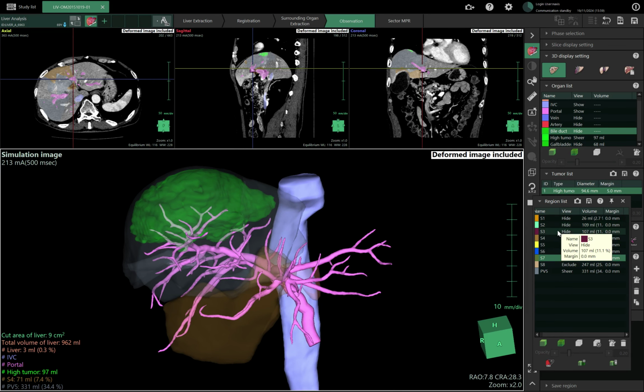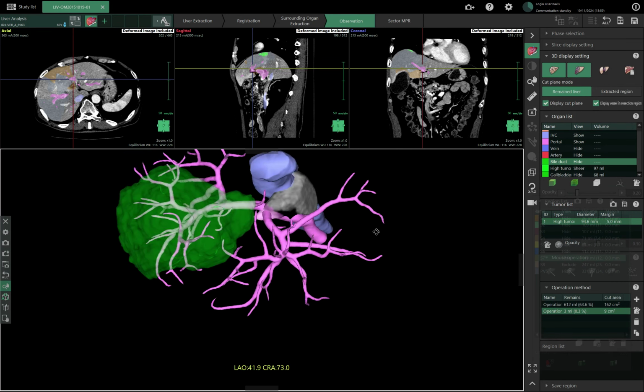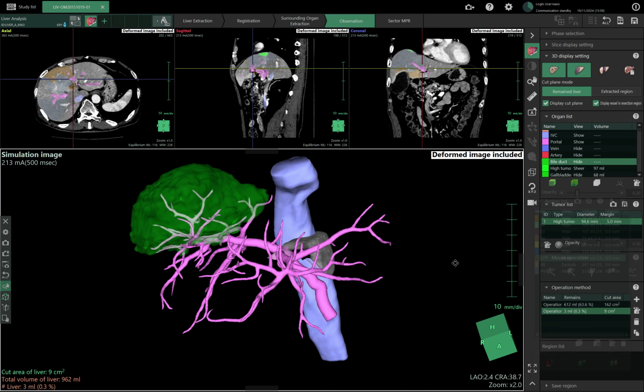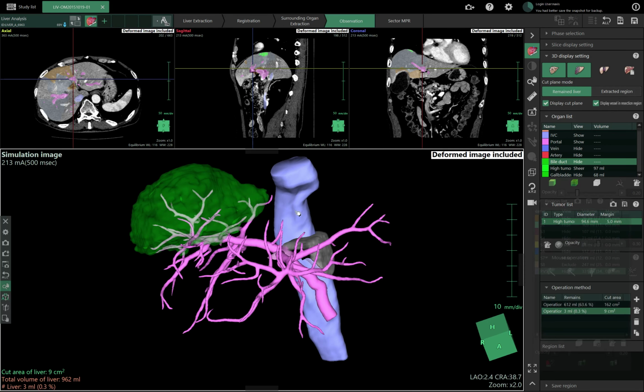Okay. Of course, when I have this, sometimes it's quite useful to display the cut plane, so we will have displayed where it's supposed to be cut. Oh, this is curious. Yeah, as we have extracted all the segments, there is nothing left to show. So this is why nothing is shown here. This is why sometimes it doesn't work as expected.